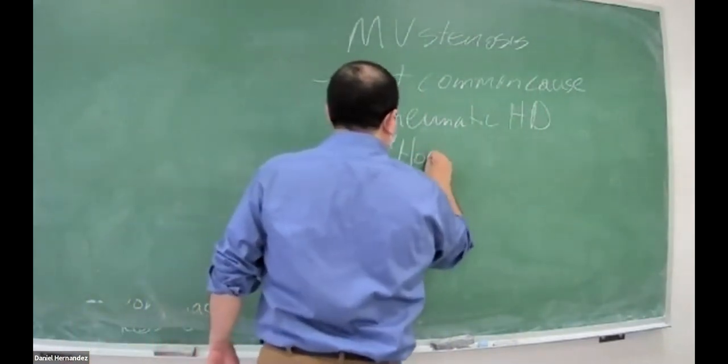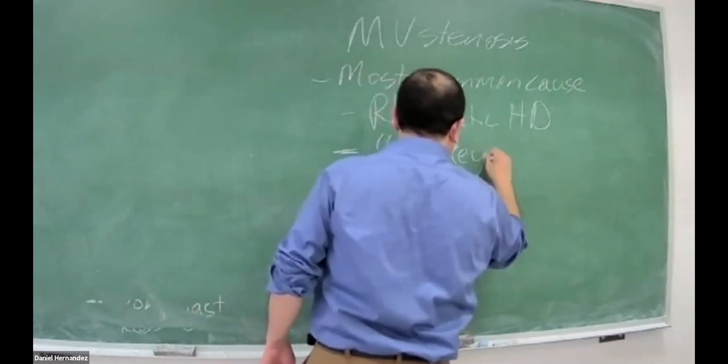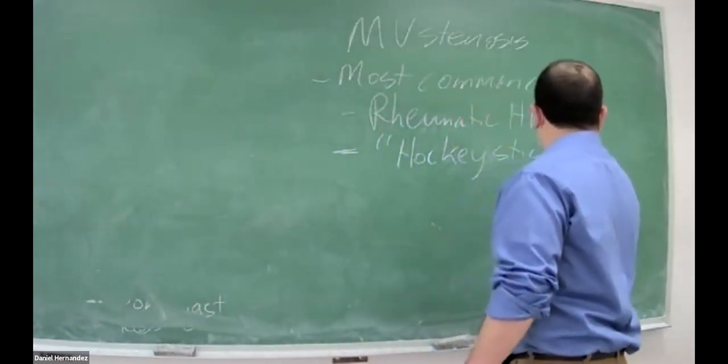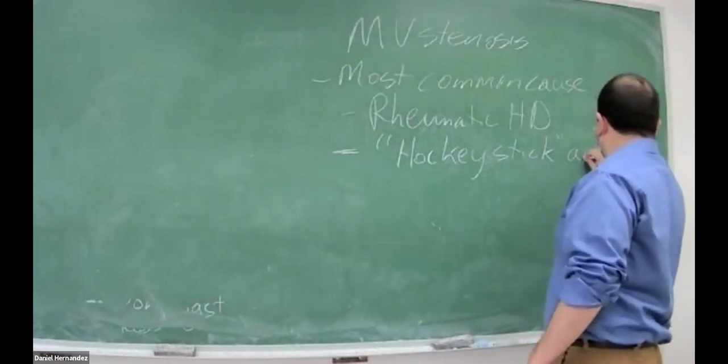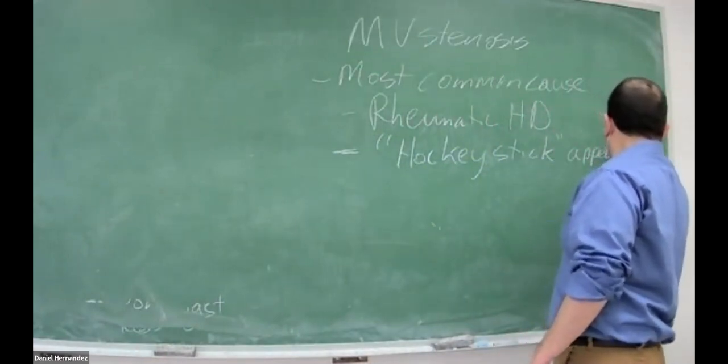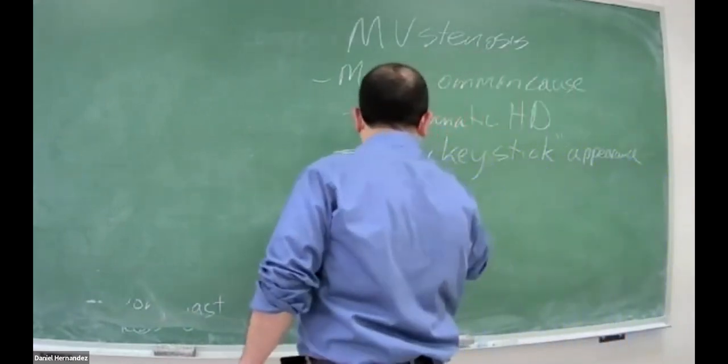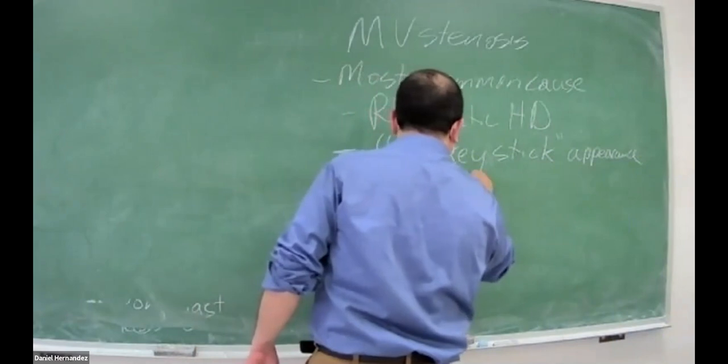You also call that hockey stick appearance of the anterior mitral valve leaflet.